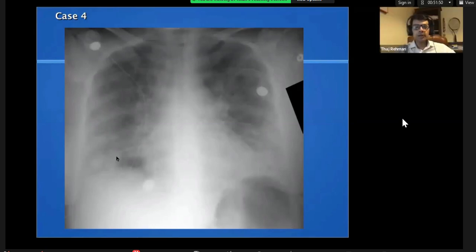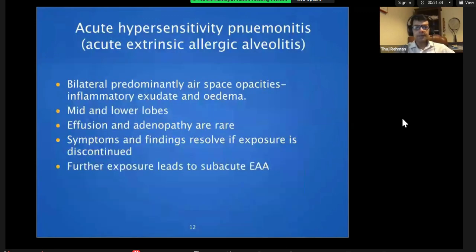Atypical pneumonias, PCP, although PCP is a bit more central than basal. If the examiner is persisting, you can give atypical pneumonias, viral pneumonias, which also give vague opacities of this kind. COVID will be extensively elaborated in the next session by my chest colleague.